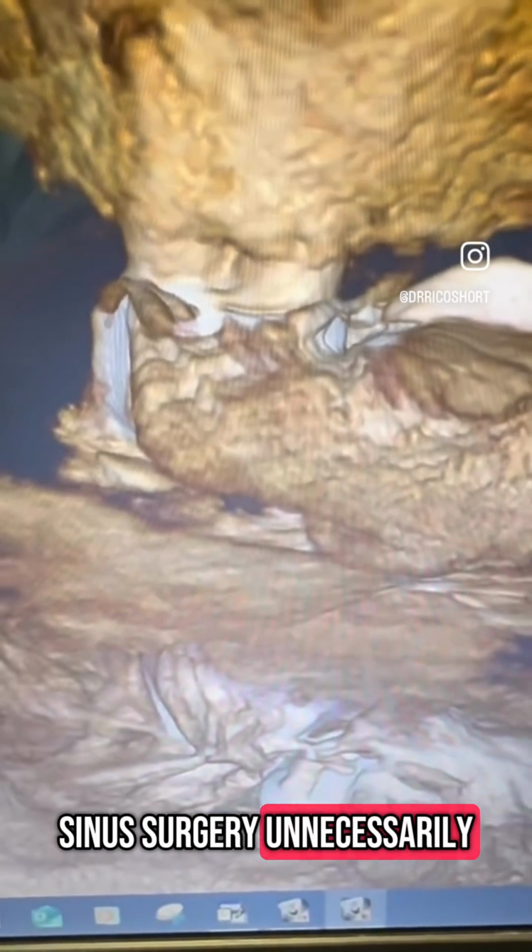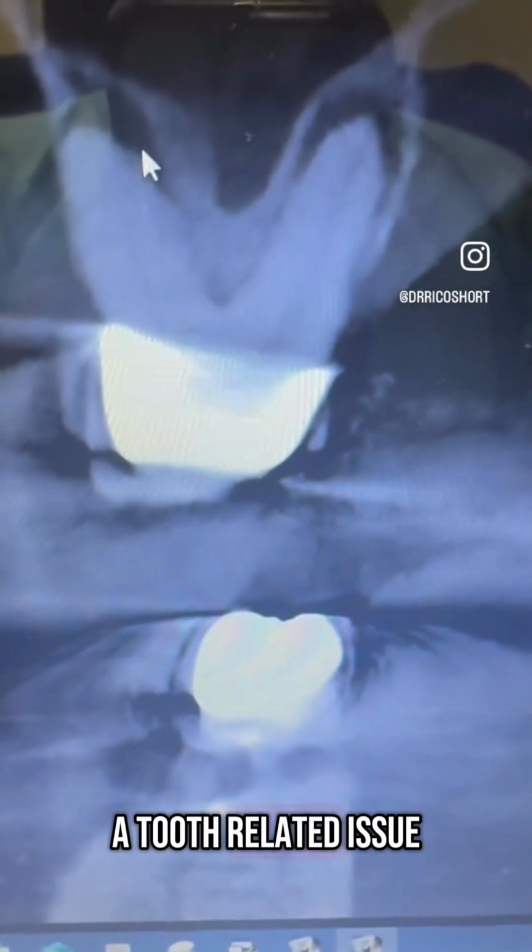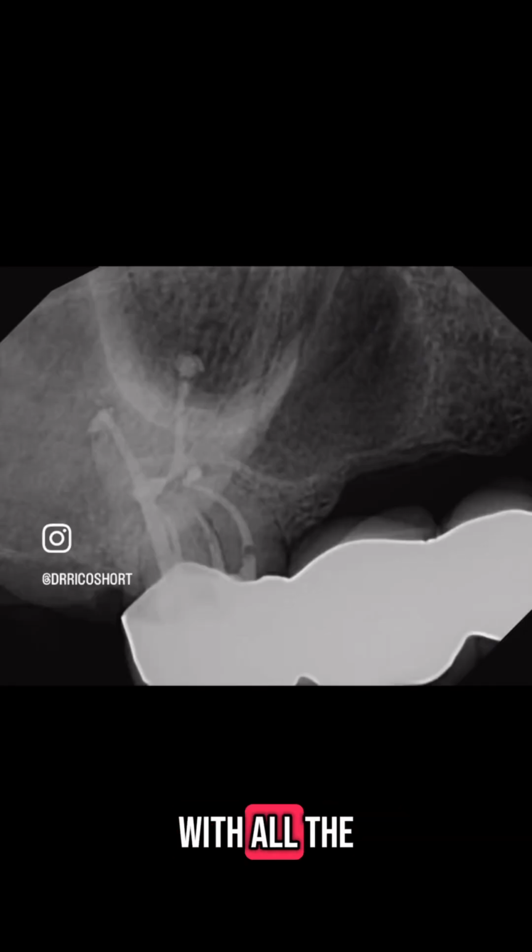So when we have a case like this, it's very important to understand that we are dealing with a tooth issue and not a sinus issue. There are a lot of patients who go to an ENT, get antibiotics, and also get sinus surgery unnecessarily because it is a tooth-related issue. You can see the pathology here on the buccal roots and also the palatal roots here. You can see that palatal root with all the bone destruction.